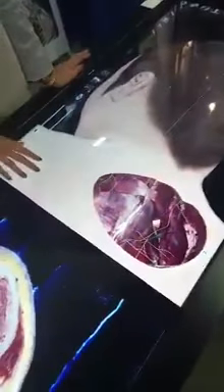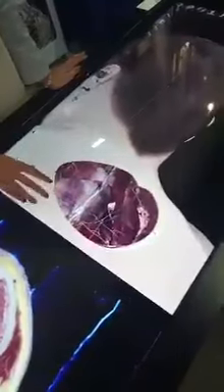If you don't want to look at the anatomy as a whole, you can also see regional anatomy. So in this case, I have the female head and neck. To mimic something that you find in surgery, you can also do natural cuts. So in this case, I have an incision made, and you can also see the relationship between the skin, the fat, and other structures. And as I showed earlier, you can go ahead and also remove structures here and press this undo button.